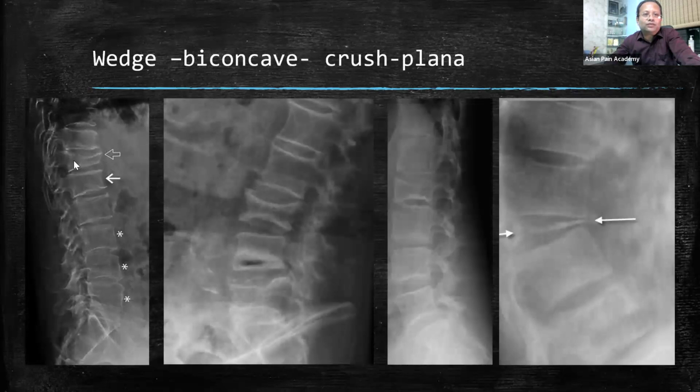As I told you, wedge fracture, this is a compression fracture but wedge fracture, and this is a compression fracture but biconcave fracture. Okay, so this of course on the posterior side is the compression fracture, and here it is called vertebra plana. There hardly any body is there. So in those cases, sometimes of course we can do it, but it is better to send to the surgeon.